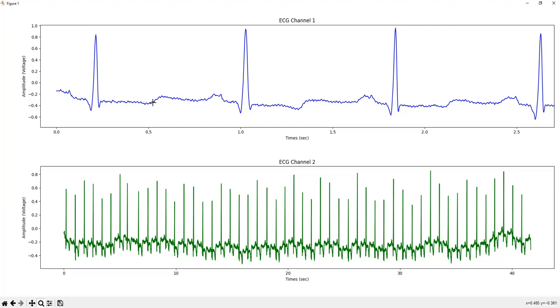And this is the T wave signal, this is the P signal, and this is the QRS signal, okay? In your heart or cardiovascular system, if this signal occurs and then the whole heart contracts, we will know that. And if we have a pattern like this one in this channel, we have the repolarization, or the relaxation, of your heart, okay?